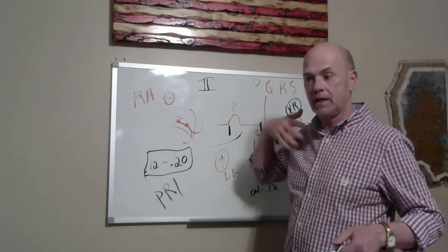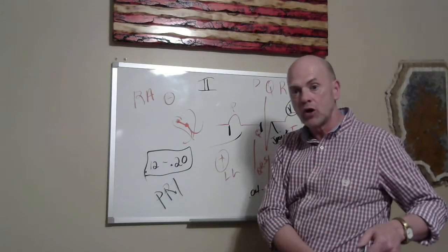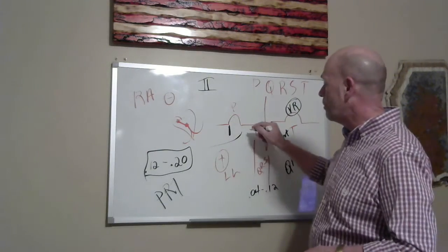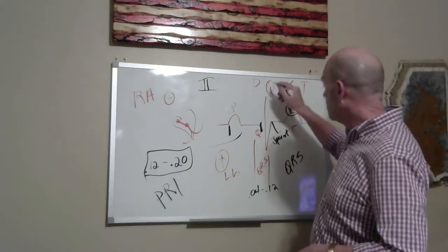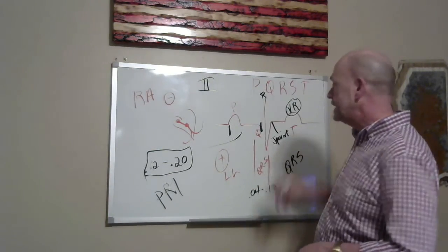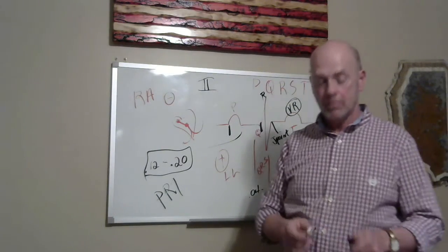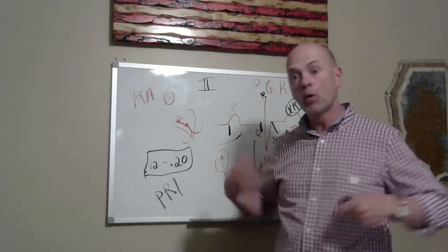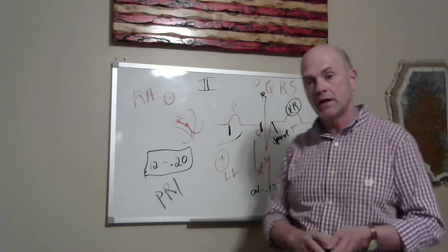So it's moving from a negative electrode, the right arm, toward a positive electrode on the left leg, and that's going to give us the most pronounced deflections, positive on a P, positive on that R right there, positive on that T. That'll give us the easiest way to see the waveforms of cardiac depolarization, atrial or ventricular, or repolarization of the ventricle.